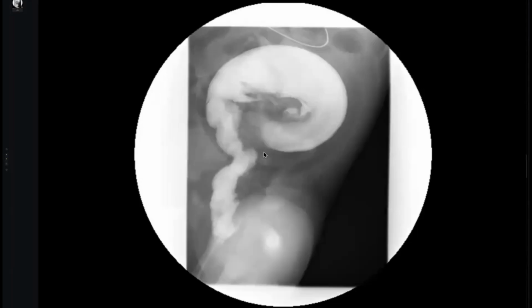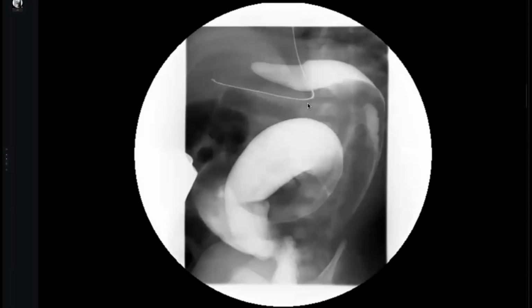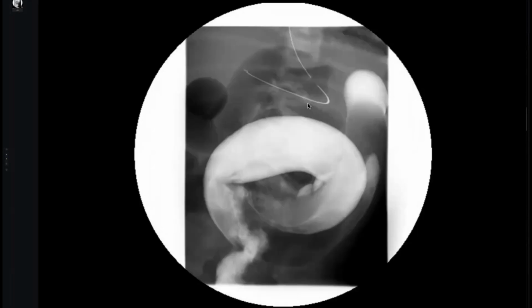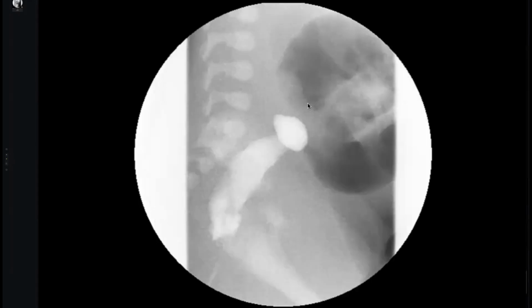Why? The main job of the radiologist is to examine well, not each slice, every pixel here and here. So if you didn't scroll, you lose more than 99% of the information about this case. I didn't expect the examiner will forgive you. This is one.